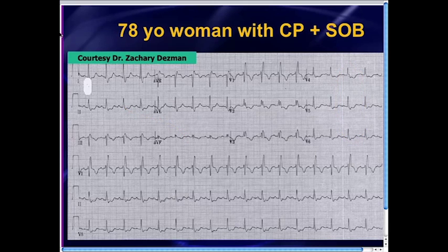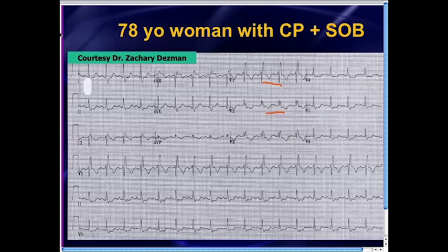And what also you should not normally see, you can see some T-wave inversions V1, V2, maybe V3 in our normal right bundle, but these T-wave inversions in V2 and V3 are a little bit more than you'd expect. And also, you see T-wave inversions in all of those inferior leads, and that's not normal with the right bundle. Right bundles, by the way, can sometimes produce T-wave inversion in lead 3, but really shouldn't produce the T-wave inversions in all of your inferior leads.